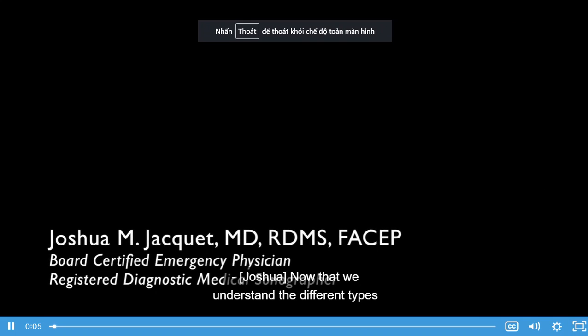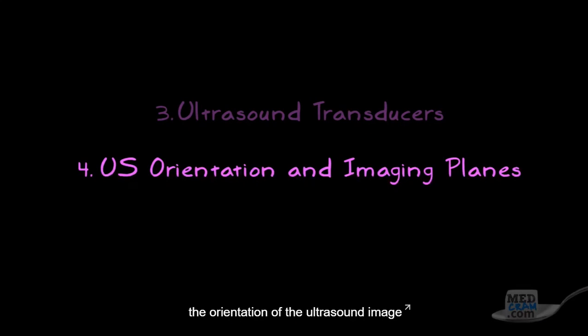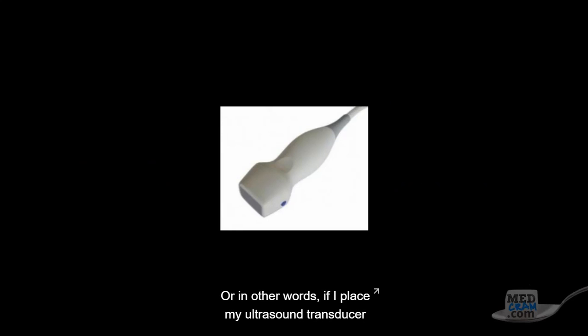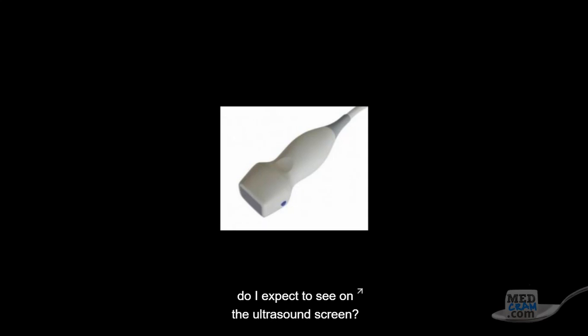ultrasoundcram.com. Well, now that we understand the different types of ultrasound transducers, we need to understand the orientation of the ultrasound image in relation to the transducer. Or in other words, if I place my ultrasound transducer on a patient, what anatomic orientation do I expect to see on the ultrasound screen?